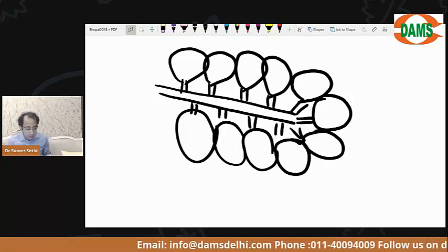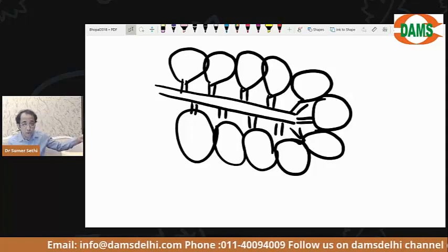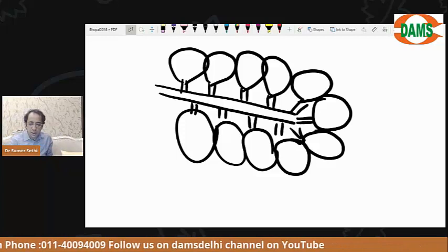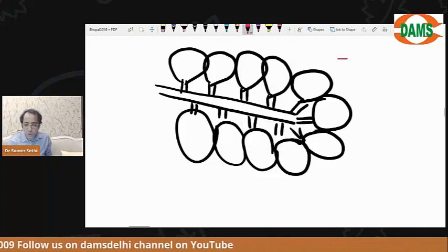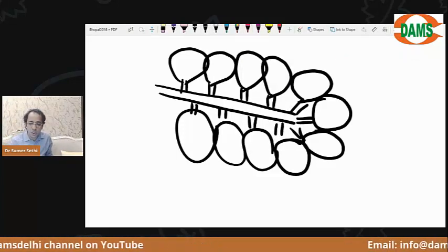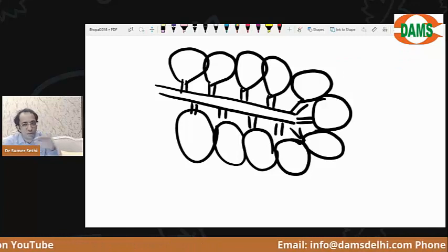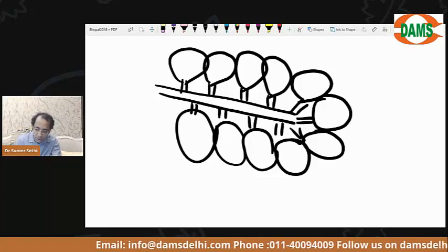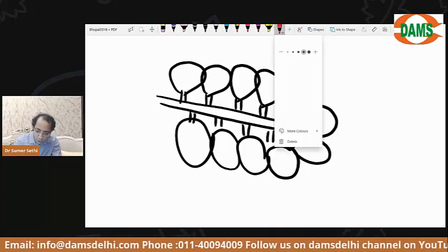That fissure was normal. It is slightly curved, but that was normal, because sometimes children come to me and say, "Sir, the horizontal fissure should be a perfectly straight line." Beta, but there are no straight lines in real life. In real life, you have some curves. It's very, very important.